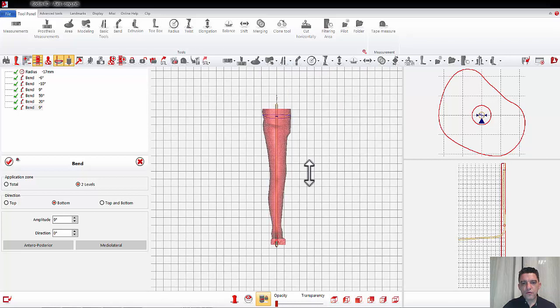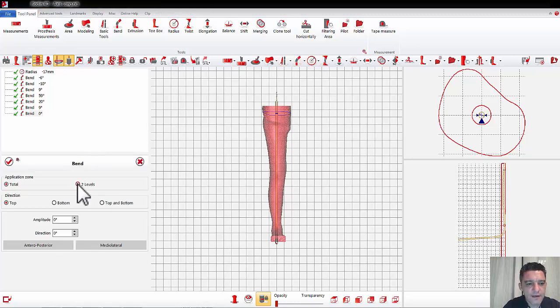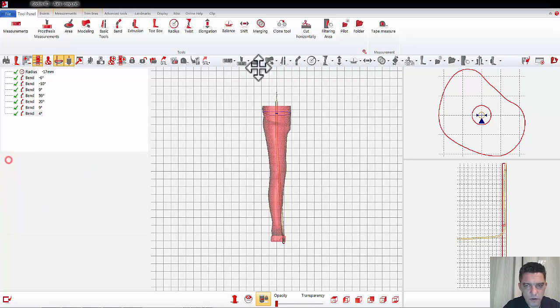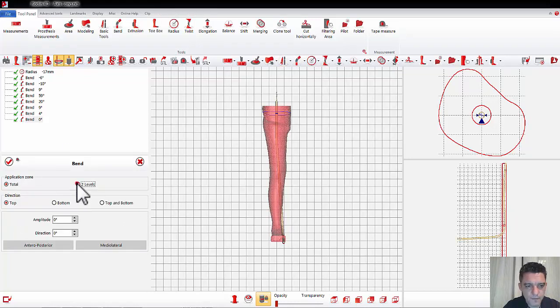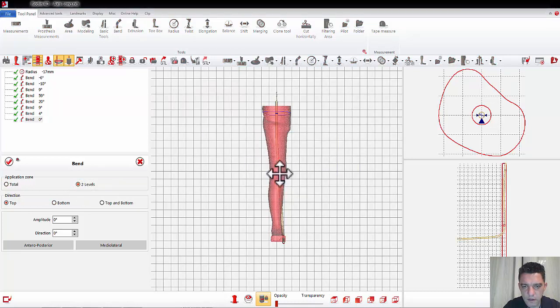from the front view, you can do, if you want, the same. But again, for AFOs and KAFOs, I didn't take care about it. But anyway, if you want to bend like this, you can do it. For example, 2 levels here and here, mediolateral bottom part, for example, something like this, two levels. Okay, 1 and 2.